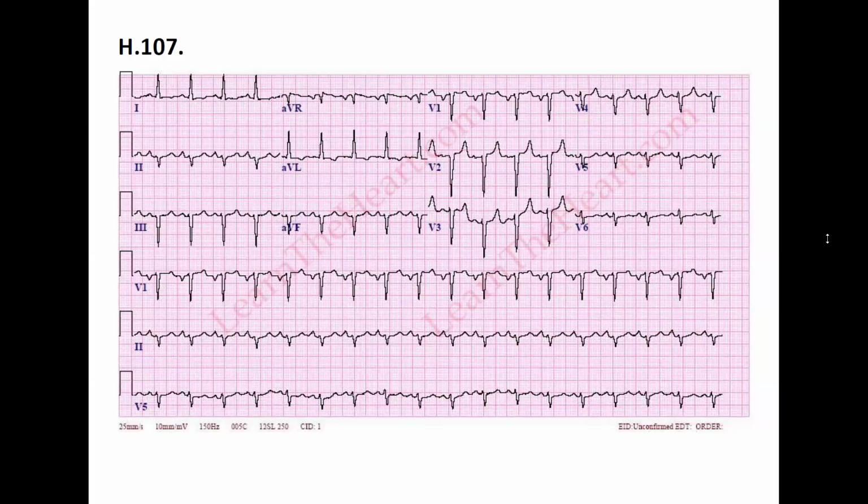So it's rhythmic, and is it a sinus rhythm? If there's a P wave, it's sinus, but first let's determine the heart rate. The rhythmic one. The heart rate is a little bit more than 100, so that's tachycardic. Okay, go on.